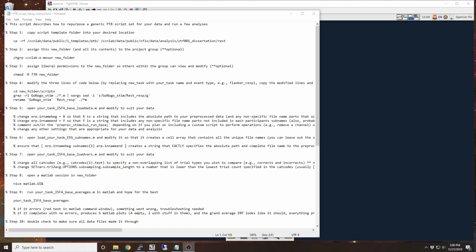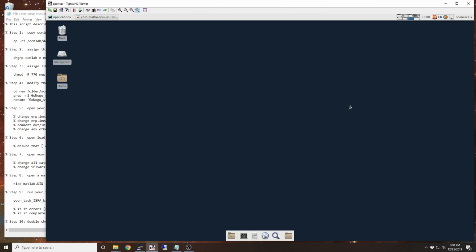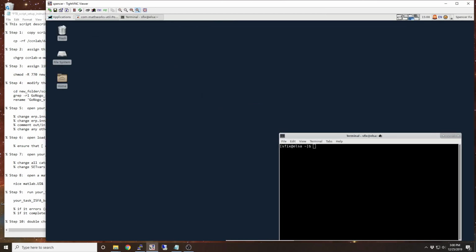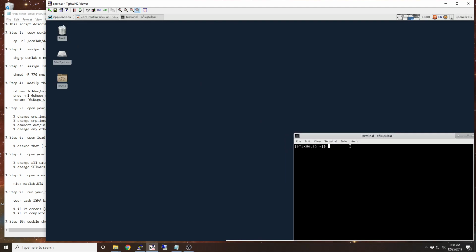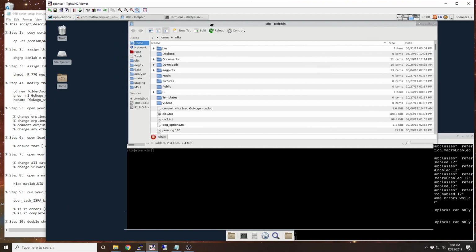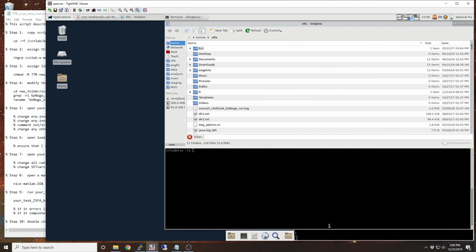Welcome. This video is going to walk step by step through how to set up a script set for PTB analyses. So I'm going to start with a blank workspace and open up a terminal window. I prefer to have my terminal window dragged into the bottom right. I'm going to open up a Dolphin browser so I can file browse. I prefer my Dolphin browser in the upper right.